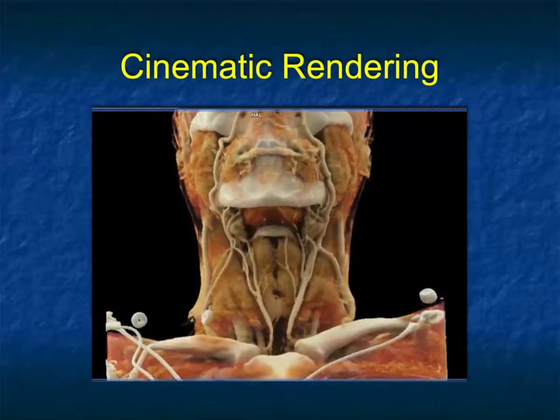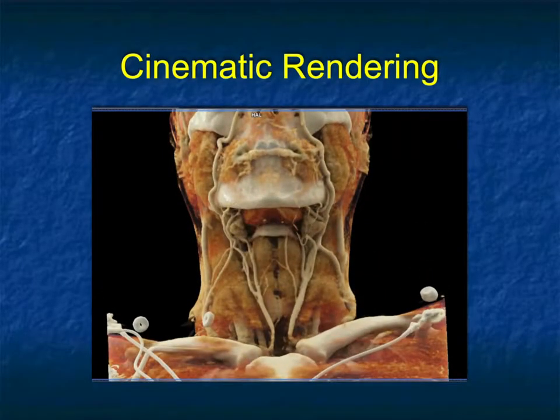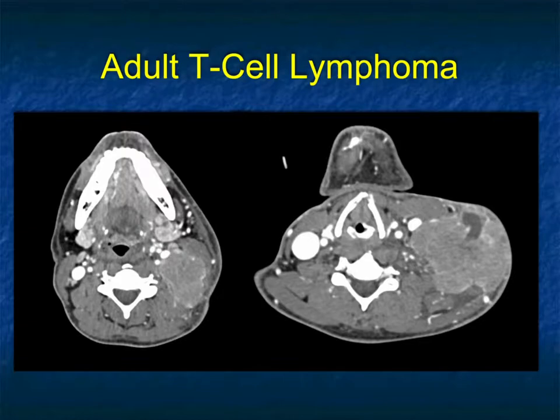Again, you can change all the parameters. This is the reason I believe you need to do it interactively, because if someone just gave me a few images, it's not really going to be as good.